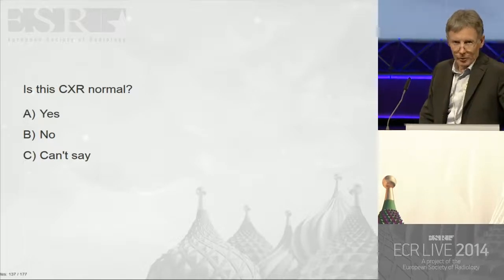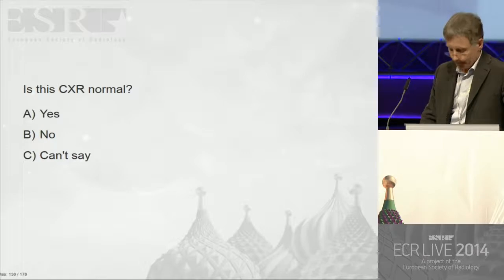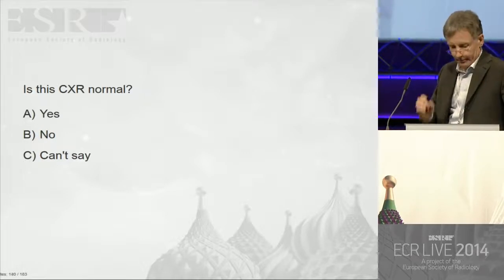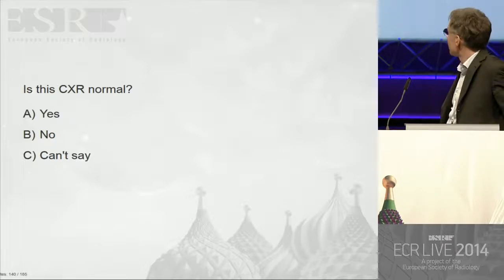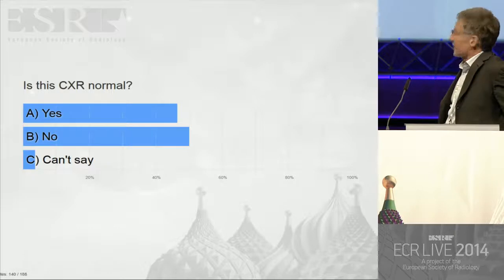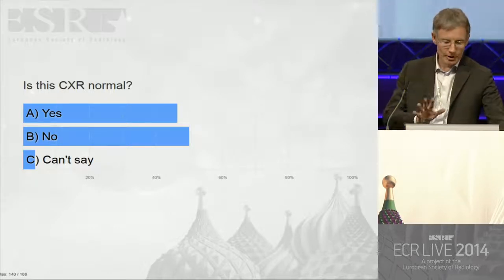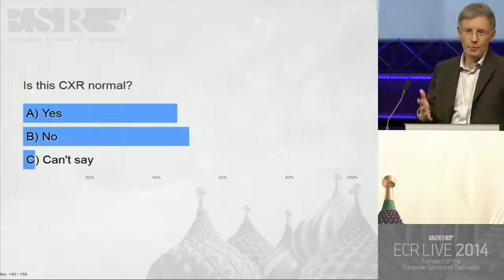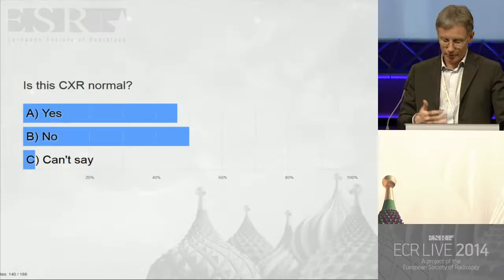Normal or abnormal? So let us look at the answers, please. Well, that's a perfect split. This means this is really working well, so I'm very happy. For those of you who, of course, said that the chest X-ray was abnormal, you'd have to come and tell me how you described it and what was abnormal.